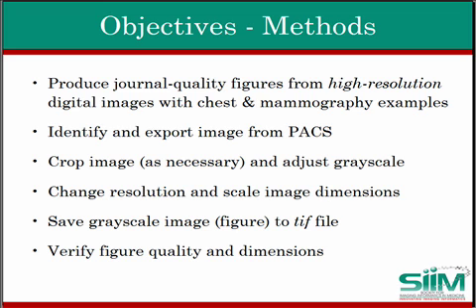Similar to the second tutorial exercise, these examples will identify, adjust grayscale, and export images from the PACS, and use third-party image display and processing software to crop images, change resolution, and scale to the specified output dimensions using interpolation. Once converted to 8-bit grayscale, the image is saved as a TIFF file and subsequently verified for proper dimensions and display quality with word processing software.